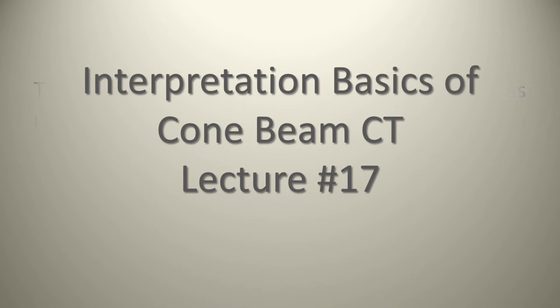Lecture 17, Interpretation Basics of Cone Beam CT. So when we looked at things like cone beam CT, there's a lot of practitioners out there that think that cone beam CT is the be-all and end-all, and that we should be taking cone beam CTs of every patient before we work on them, after we work on them from an implant perspective, on 5-year-olds to diagnose pathology.